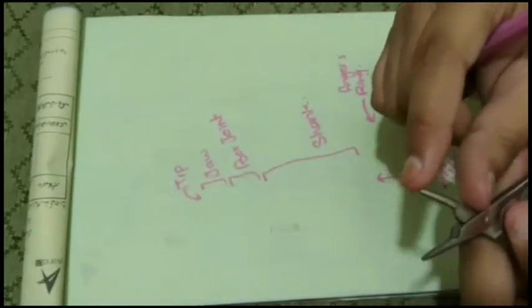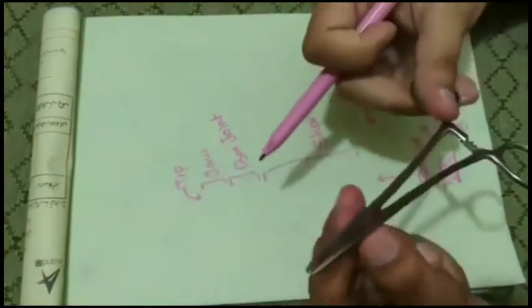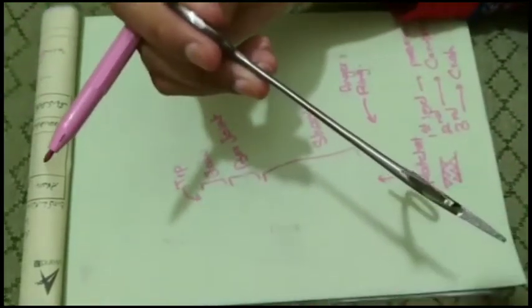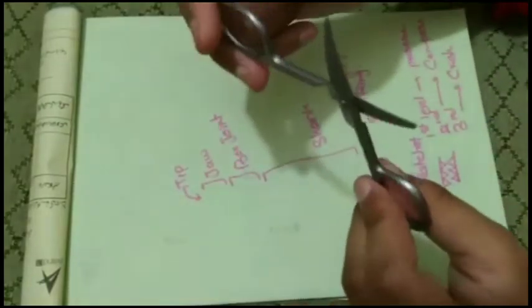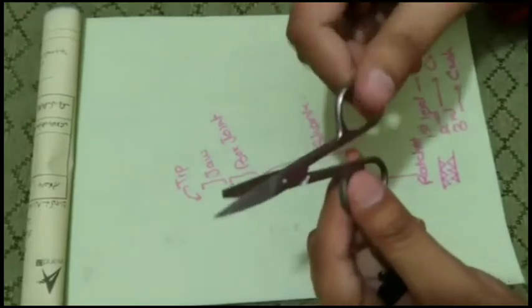Tips could have teeth or they may not have teeth. Here we don't have teeth. It helps us in preserving the organ. This is the box joint, in which one layer goes inside the other layer. The other layer has space inside it, which allows one layer to go inside. As you can see, it is going inside. It is different from the scissor, which has no inside space. They both have their own layers, and this is the sliding joint of the scissor.